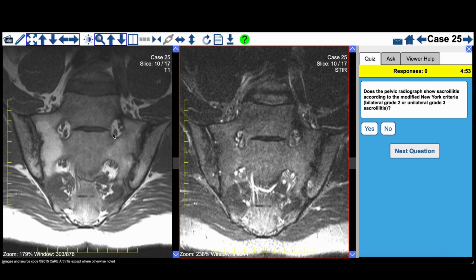So this patient does indeed have axial spondyloarthritis. And even though there isn't much bone marrow edema on the pelvic MRI, these patients may indeed respond to a biological therapy. So it's very important to make this diagnosis. This MRI evaluation can be transformative for this patient's life.